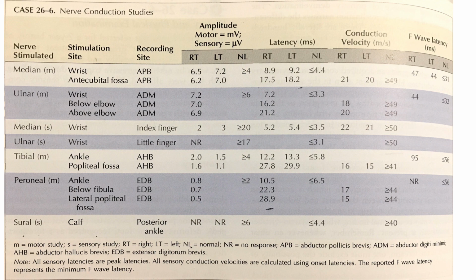Now, again, in clinical practice, we often see mixed patterns, such as a mixed pattern of diabetic neuropathy involving both axonal and demyelinating features, but we try to focus on the chief highlights that we can use to characterize the neuropathies into axonal and demyelinating forms, and further classify the demyelinating into acquired forms such as CIDP and inherited forms such as CMT. So, Dr. Khanna, what do you think would be the main takeaway points from our video today?